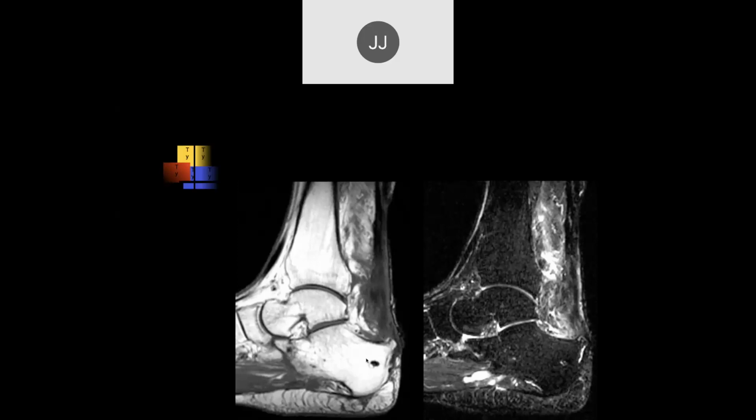Eliar, what do you think of this one? Yeah, lots of irregular signal in the distal Achilles tendon there. Yeah, just a bony protuberance in the posterior calcaneus, Haglund deformity, lots of edema in Kager's fat pad. Is there a suture anchor in the calcaneus there? Or maybe it's, I just don't remember what that is. Okay. Yeah, I don't think this patient had surgery.